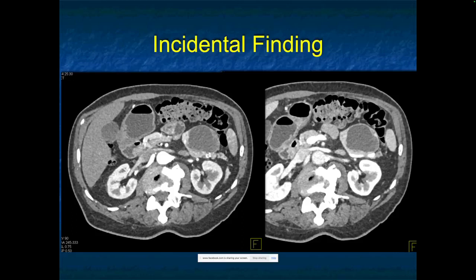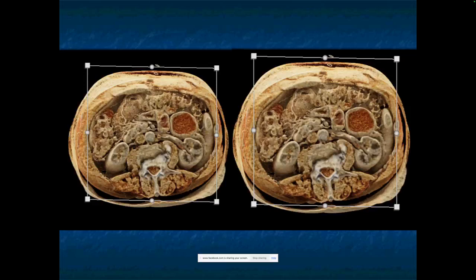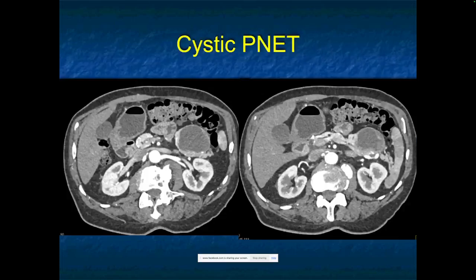Incidental finding, cystic lesion, tail of pancreas, thickened wall and nodularity. There it is in the coronal. Cystic lesion location. Could it be an MCN? Possibility. Could it be an IPMN? If it's an IPMN with a wall thickening, then it has malignant change. Cystic lesions also, you got to think about neuroendocrine tumors. I've shown you, and we've discussed neuroendocrine tumors, typically hypervascular, but they can be cystic, nodular wall, rim enhancement are all possibilities. Metastasis. Here is that thickened wall, the enhancement on the cinematic rendered views.